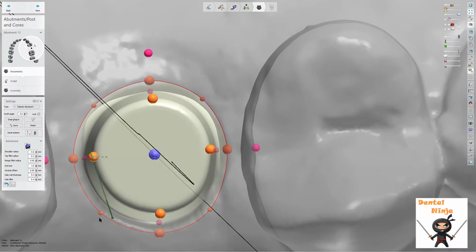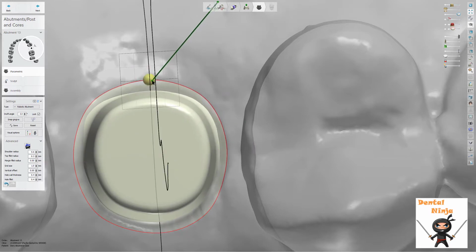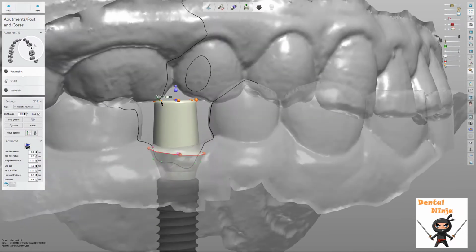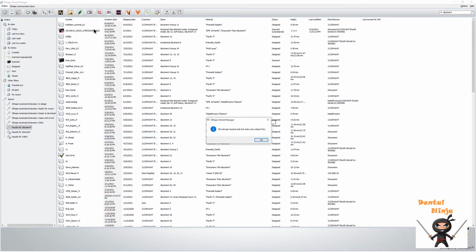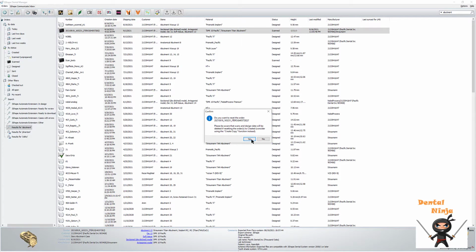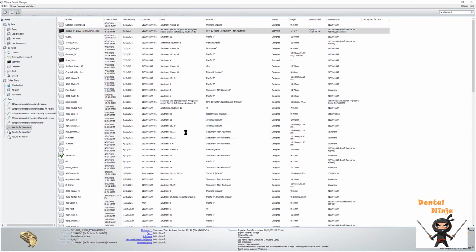The only thing you would have to do is enable it in the RX that you have a gingival scan, but you would have to be renaming a few other case files across. You'd have to change the names. So let's say this is all set and done. I will show you what it will look like if you do the pre-op workflow, where they scan the pre-op, but you need to correct it on the file end.